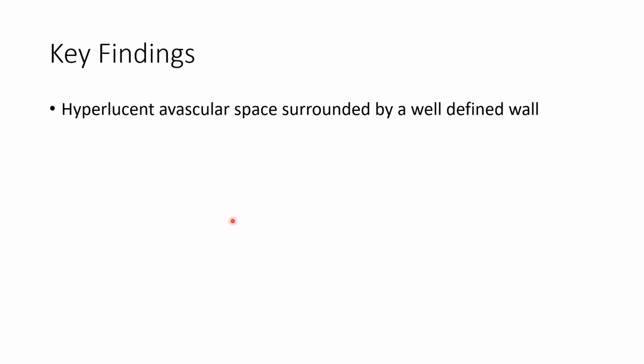Pulmonary cavity. The key finding in a pulmonary cavity is a hyperlucent avascular space surrounded by a well-defined wall.